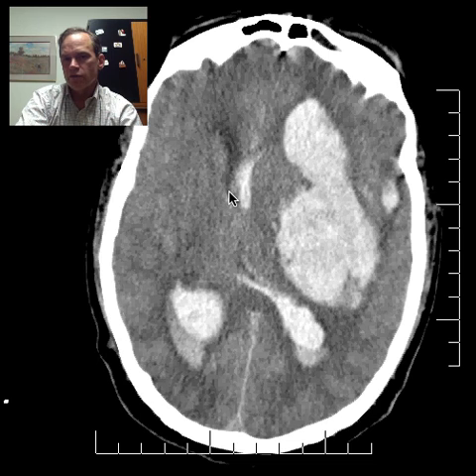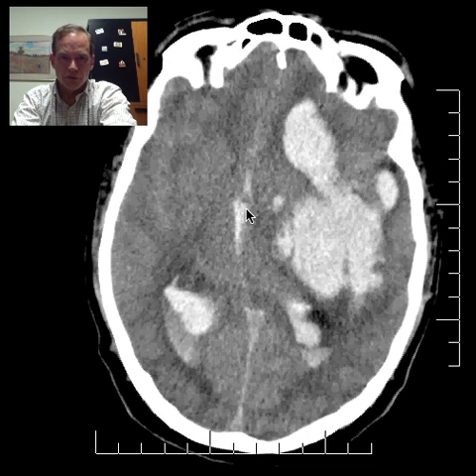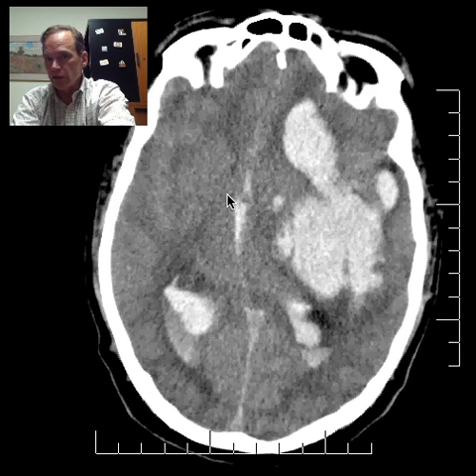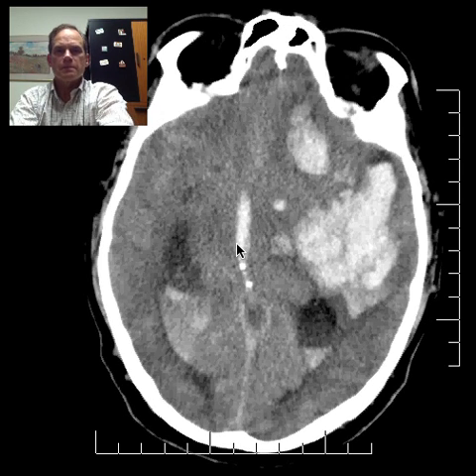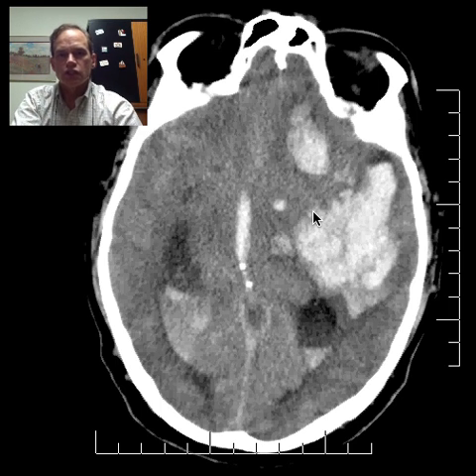So you have a foramen of Monro on both lateral ventricles going into the third ventricle. The blood empties from the lateral ventricles through the foramina of Monro into the third ventricle. Okay, now where's it going to go from there? What little channel connects the third ventricle to the fourth ventricle?